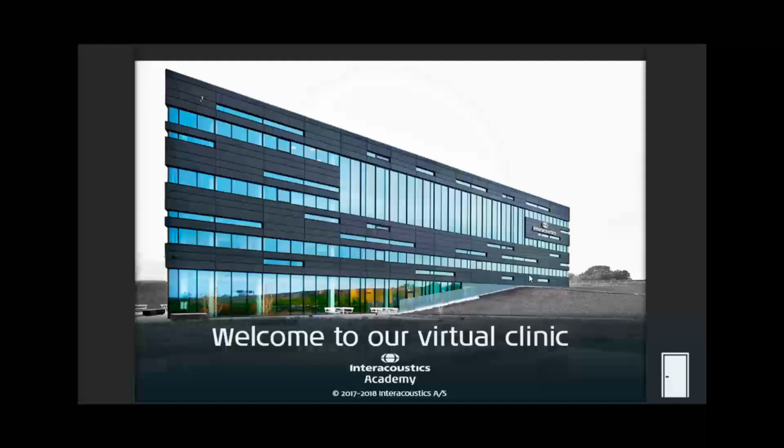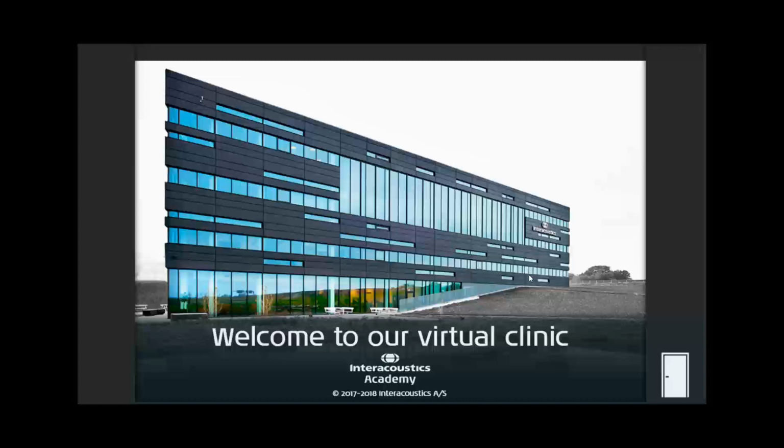The aim of the virtual clinic is to correctly diagnose your patient in the shortest time possible, whilst at the same time ensuring that your testing is both thorough and complete. The purpose of this video is to provide a quick guide on how to navigate through the course.